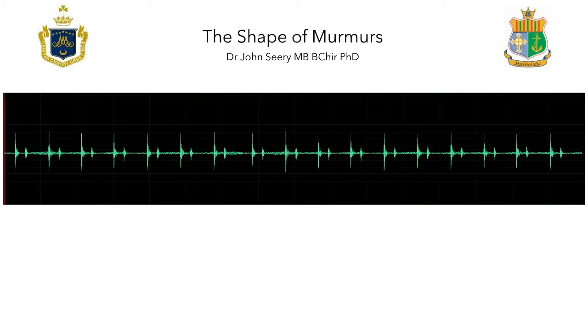From an educational point of view, it can be very informative to look at the waveform of murmurs while listening to them.